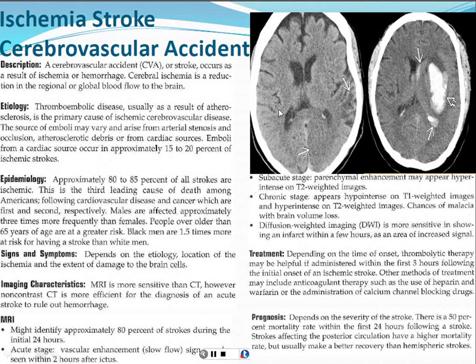And MRI has become really, really important in the diagnosis of acute stroke because unfortunately even these subtle changes take hours to develop, and if they want to treat a patient with stroke with medications, they have to get them within a couple hours and get them treated. So a lot of centers will just do a CT, make sure there's no bleeding in the brain, and then they'll give the medication, which is a blood thinner, to try to open up the vessels and improve perfusion of the brain, and it often helps.